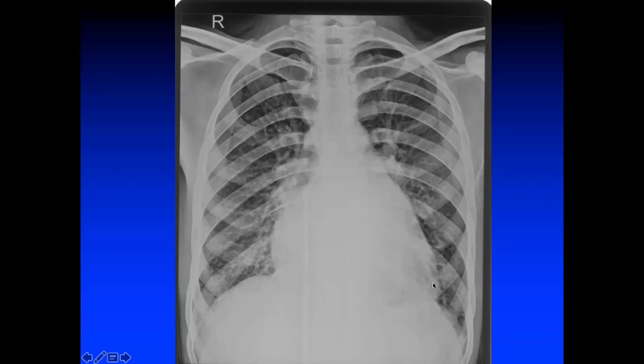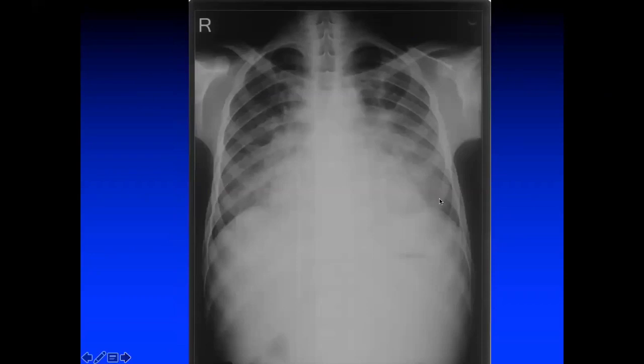And this is the most confusing thing in exams. You are given a case presentation, and then when you are asked to present an X-ray, you get confused whether it's an LV apex or an RV apex. So an LV apex always appears with an obtuse cardiophrenic angle. And this is a very hard point. This is not a subjective thing, this is a very objective thing. Sometimes the downward displacement might look subjective, but if the angle is always obtuse, it's always an LV type apex. Again, you can see the angle very clearly. The angle is obtuse. So this is again a classical example of cardiomegaly. CT ratio is more than 0.5, and you will have an LV apex.